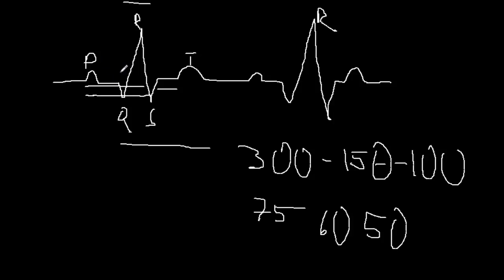So there actually is a lot you can tell about this area right here. I'm going to go quickly through the different kinds of heart block. I'm not going to do a lot of writing on it, but there are some things you should know.